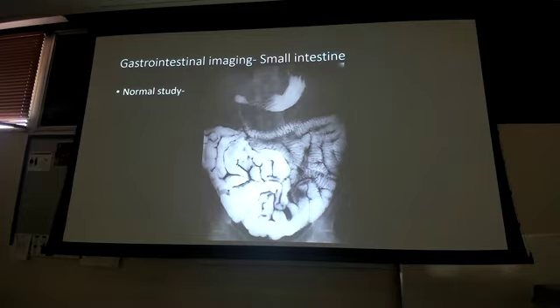All right. This is what I was talking about, that small bowel follow-through, in that one picture of the stomach we had, how much contrast was in there, right? This is the final picture, okay? What the actual study looks like is they take a picture here, and they take a picture like every 30 minutes and watch the contrast march out through the small bowel. And they're looking at all of those pictures. Because this bright white was bright white more up here approximately in the beginning.